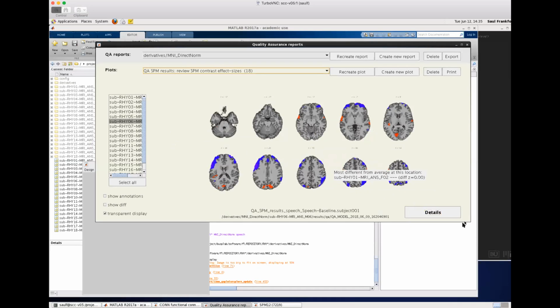But the negative, those big ribbon-like looking sections of activation showing a negative activation, probably means it's motion related, I think. So that probably indicates that even after regressing out all of the motion covariates and removing all of the noise and outliers, there is probably still some task-related residual motion.